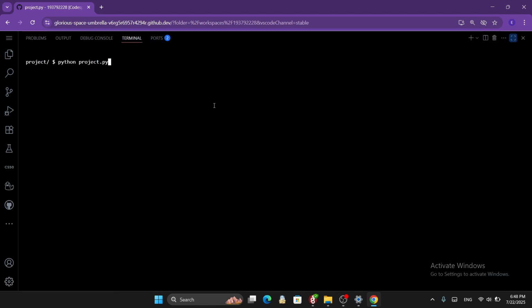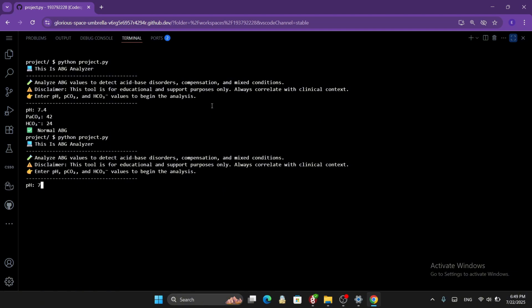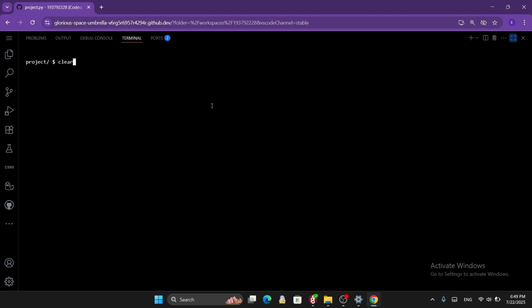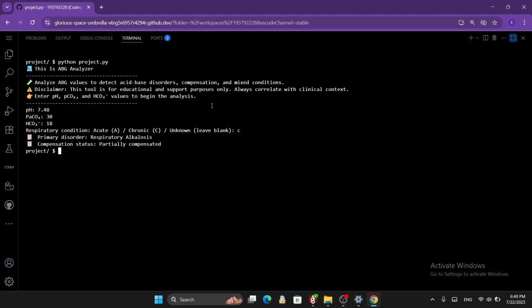Now let's do some examples. First, I want to enter a normal ABG. Let's do another example. Let's do another one. And last example.